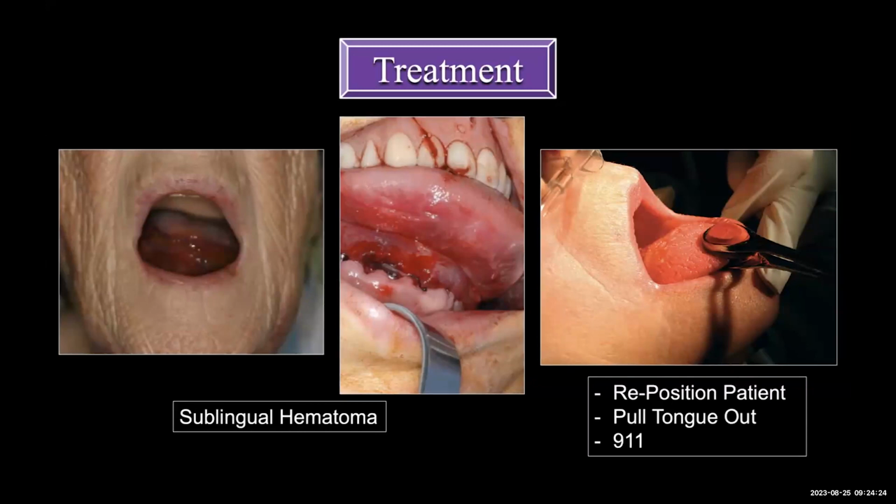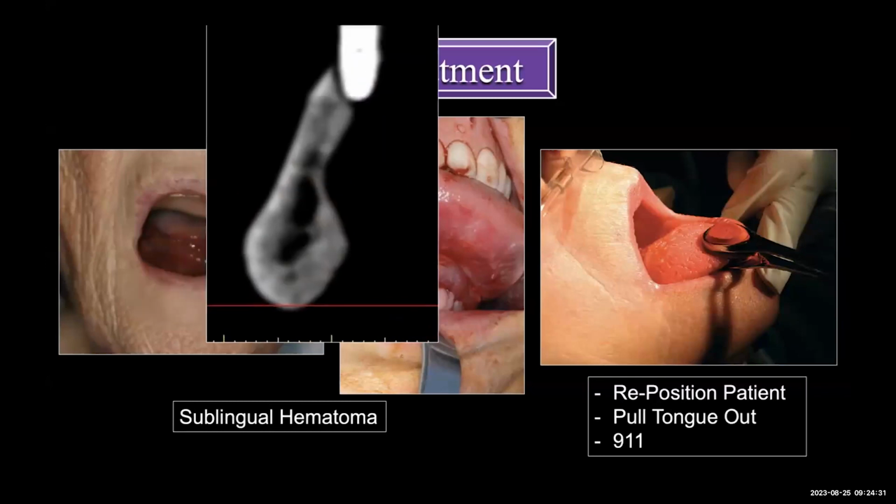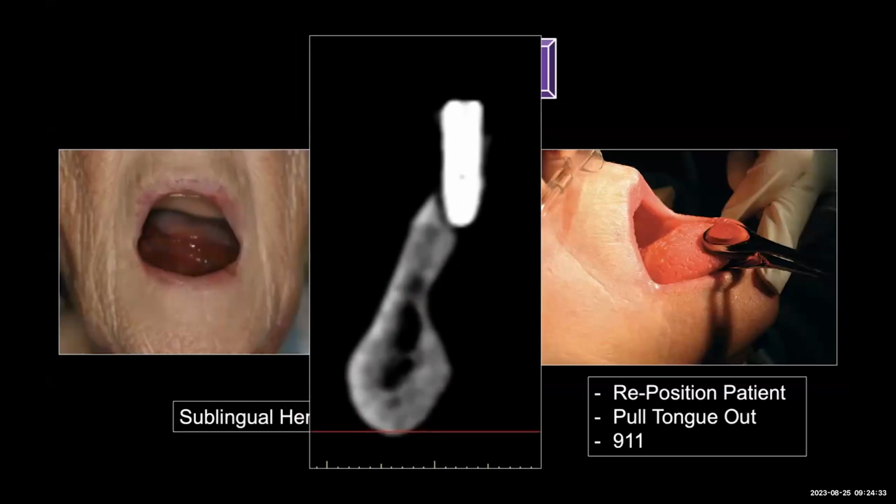So you can see where going outside of the bone can be very problematic and lead to a life-threatening situation. Now, there are also doctors that will look at these constricted mandibles, and how do they treat it? They treat away from it. So I want you to look at these cases and remember, every patient doesn't need an implant. And these patients anatomically are very difficult. You have to do very aggressive bone grafting.